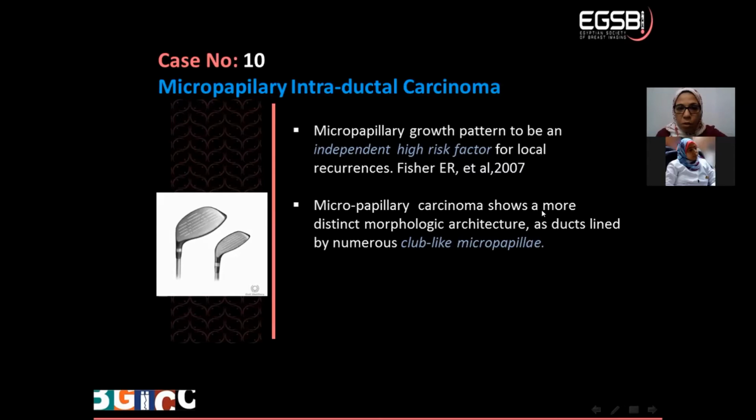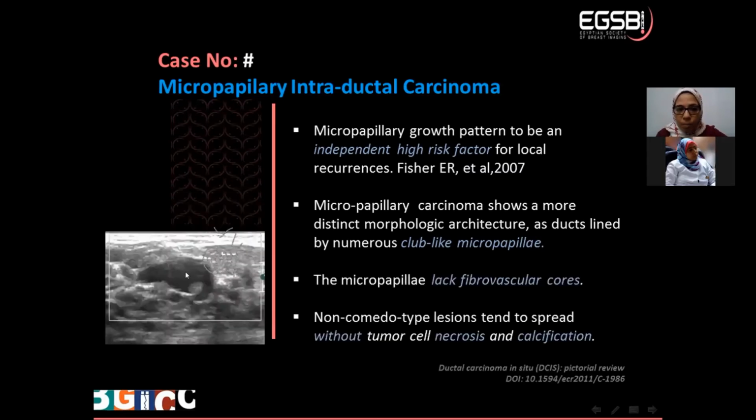Also, the micropapillary carcinoma shows a more distinct morphological architecture, and it has been reported to show a club-like micropapillary pattern, and here we can recall our ultrasound finding of this tiny intracystic papillary lesion. And also, it is known for a lack of fibrovascular cores. This is also found in our case where no Doppler ultrasound signal was reported, whether for the solid intracystic lesions or even the whole lesion.